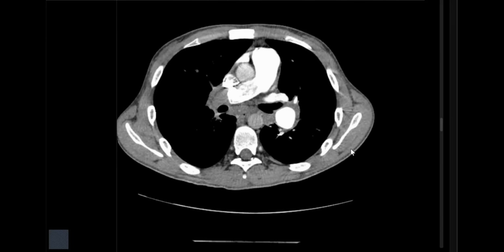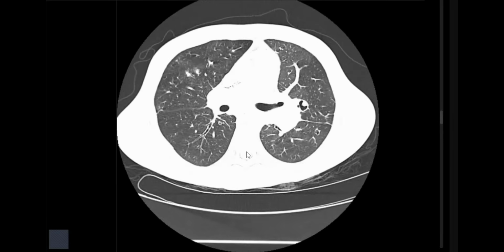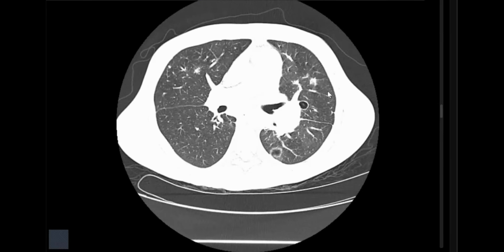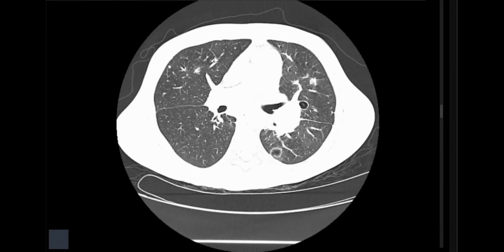You saw the lung window. Do you suggest tuberculosis as a primary etiology? Yes, because it could be because of the cavitary lesions, but not all the features. Cavitary lesions and pulmonary nodules in a 25 years old patient, TB is not likely. No other features, no tree-in-bud nodularity.